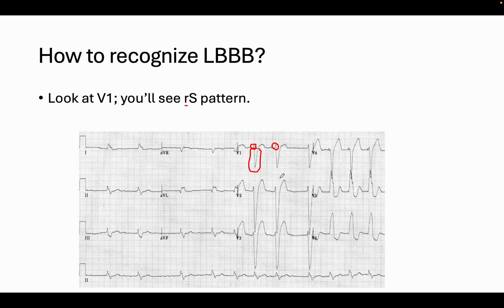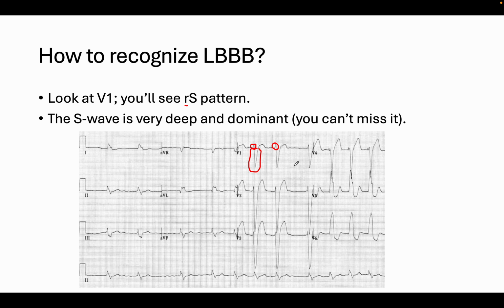Again, people talk about William Marrow. It's a load of rubbish. You'll see left bundle branch block, and you'll never need to think about William Marrow ever again by just using this recognition. Exactly, you can't miss it. This S wave is so deep, you can't miss it.